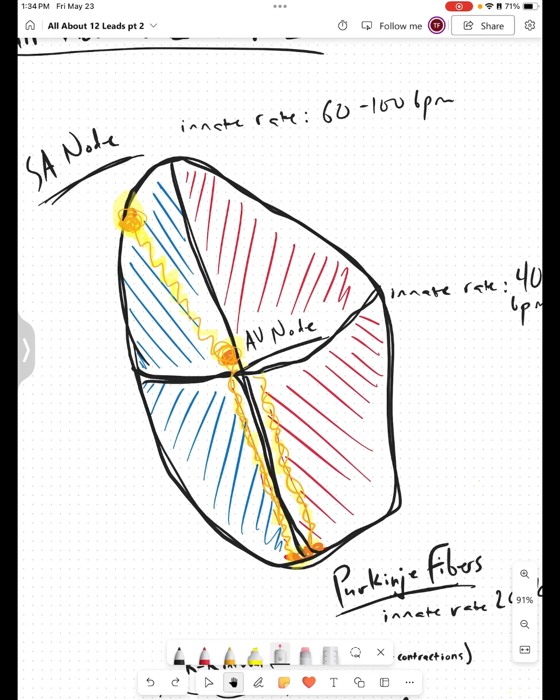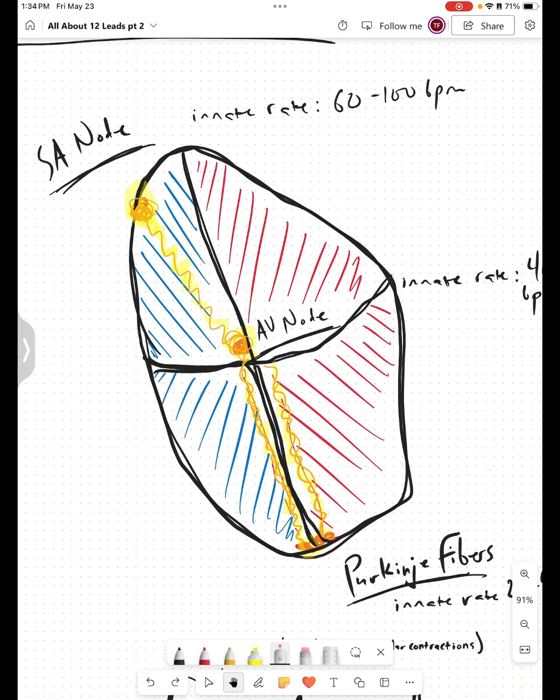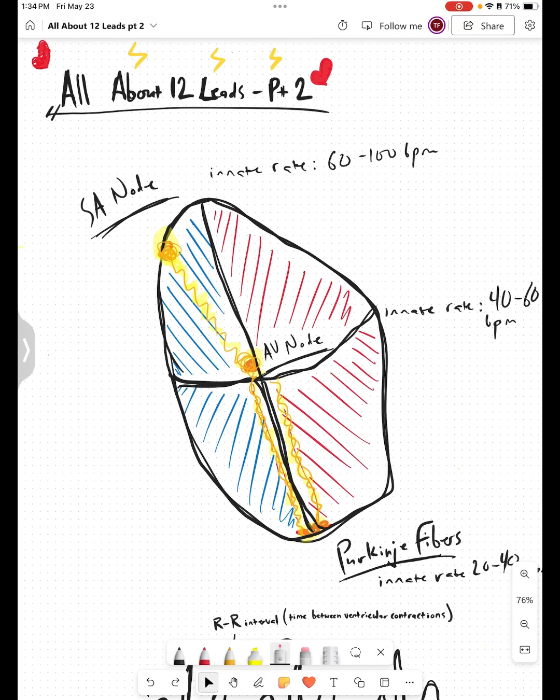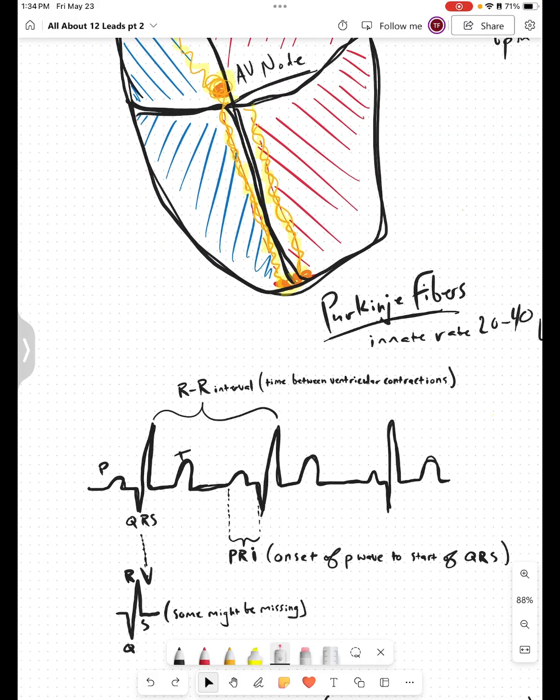But that does not mean that, we'll get into that. We'll get into tachycardic rhythms. I don't want to get too far into the weeds there. So let's start with actual rhythms here. So this is a review of that cardiac rhythm here.